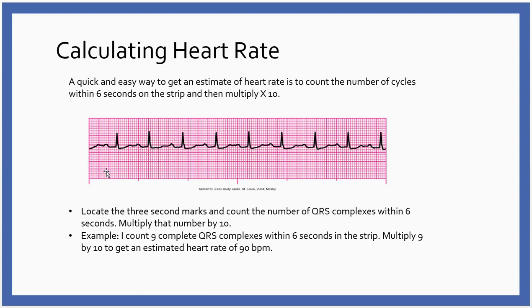So we do use that in clinical practice, and I want you guys to get used to the time aspect of things. So on most of the strips, I cut the time off because I'm going to make you figure it out.